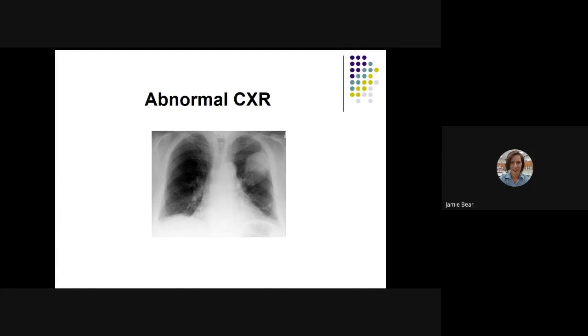Okay, so if you're looking at this one, boy, you're seeing some problems, okay? So the airway is shifted to the right some, right down here, okay? You're seeing the clavicles look pretty symmetrical. Oh boy, do you see some problems right here?